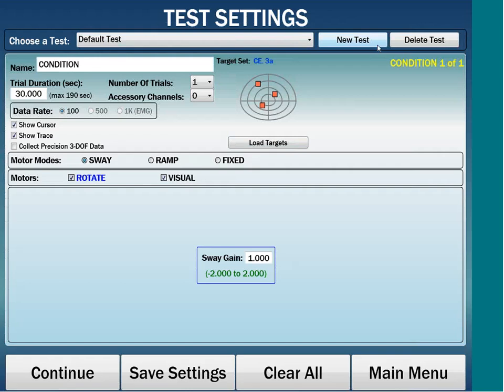The user interface has been designed from top to bottom, so that is the flow in which I will cover all of the functionality. Here, upon pressing new test, we can name the study, and we will cover that in a case study later. Deleting a test is self-explanatory.